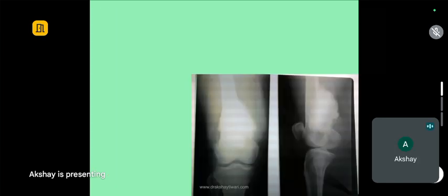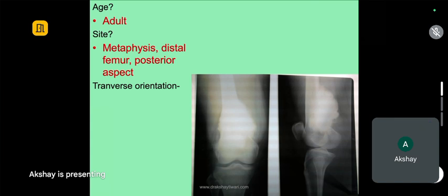अब अवनीत ये बताओ आप, एज skeletally... Sir, cannot comment on the... no sir, physis is closed, sir. Closed है, so skeletally mature. Site is metaphyseal. It's a well-defined geographical lesion with narrow zone of transition, sir.